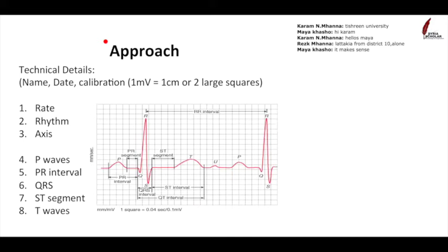Good. All right. So, as I said before, having an approach is the key thing to being able to understand an ECG. If you just look at it to start with, it just looks like lots of squiggly lines. So you need to systematically take each part in turn, and that way you don't miss anything, and you know that you've checked for all the important things that could go wrong.